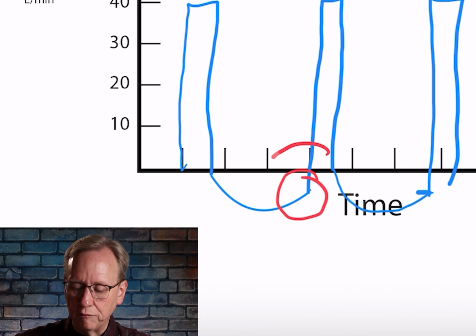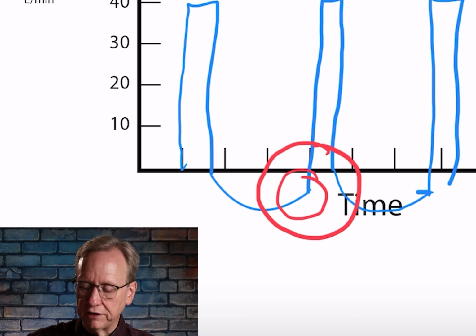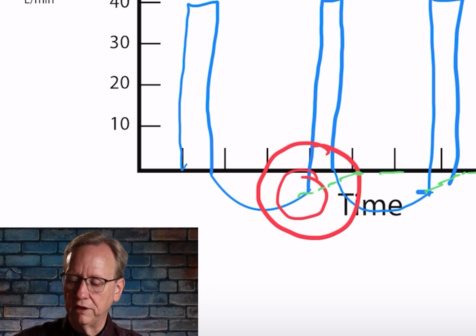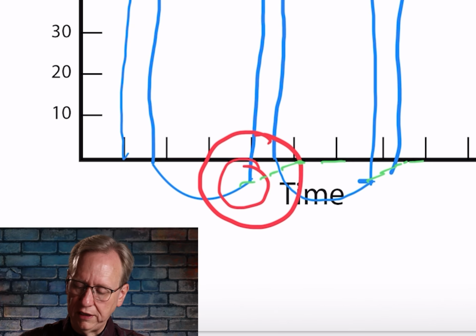We want to buy ourselves more time, so there's time for this little graphic to go all the way up to the baseline before the next breath begins. And that's what we're looking for. And so that's auto-PEEP, air trapping, so we watch for that. Watch that very closely.